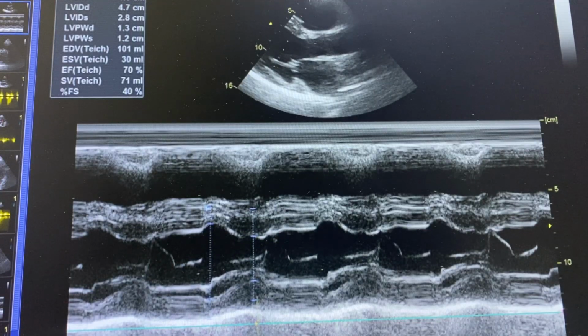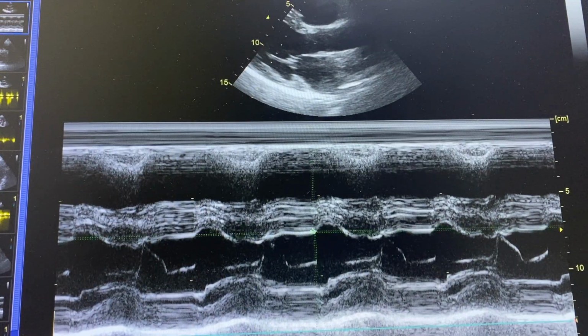Now, if you see on this image here, again, I'm trying to measure, so this cursor, you can see it moving. From here up to here, this first line here is the one that is passing from here up to here. So that one is part of the RV trabeculae. Now the real IVS will start from here. You see this line? It is consistent, this line here.